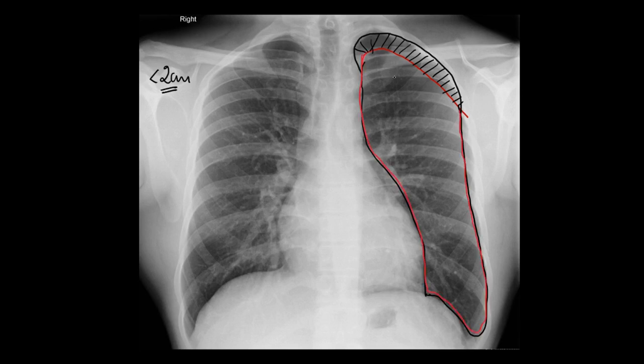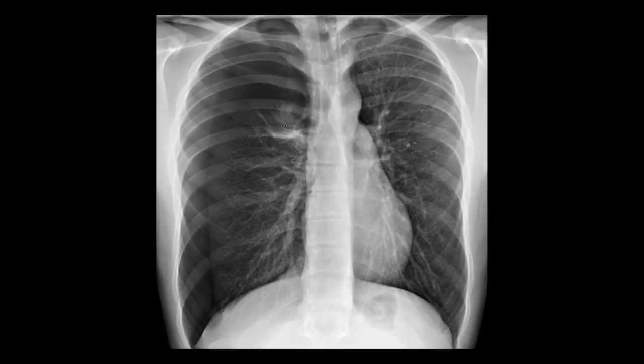And also to point out to you, unlike the previous tension pneumothorax we've seen, the red denotes the visceral pleural layer, and it's just underneath the parietal pleura, which is shaded here in black. So you can pause the video again.